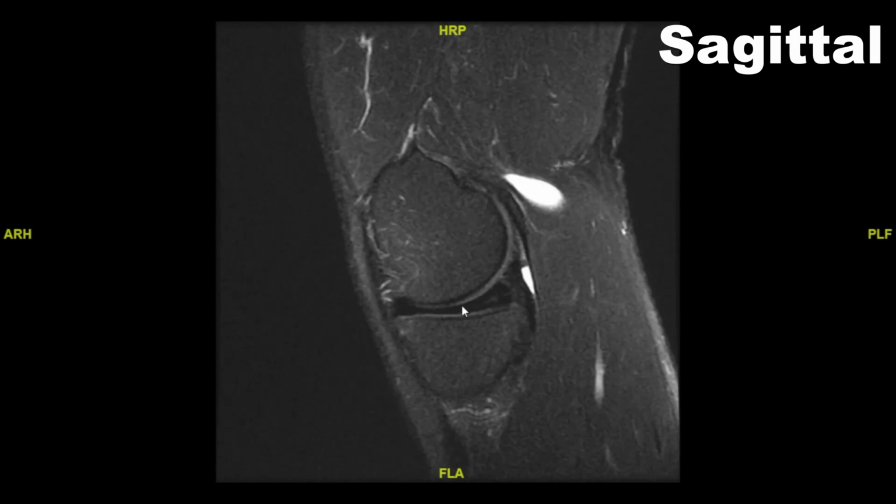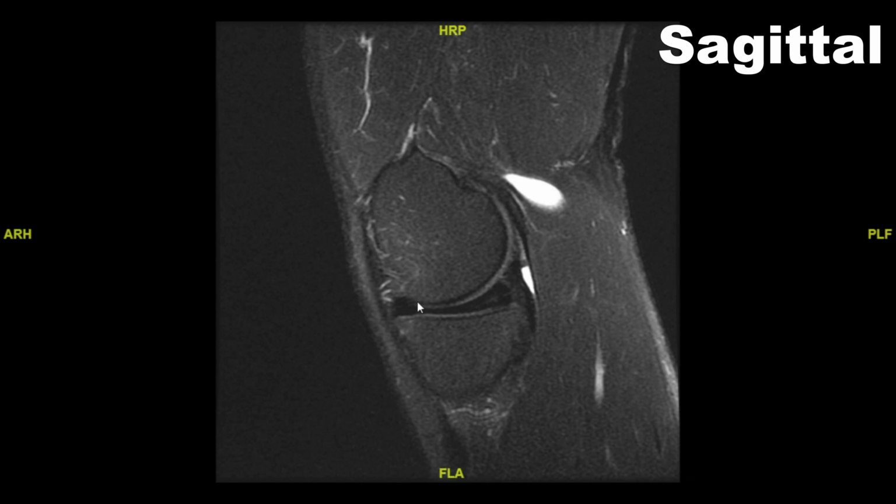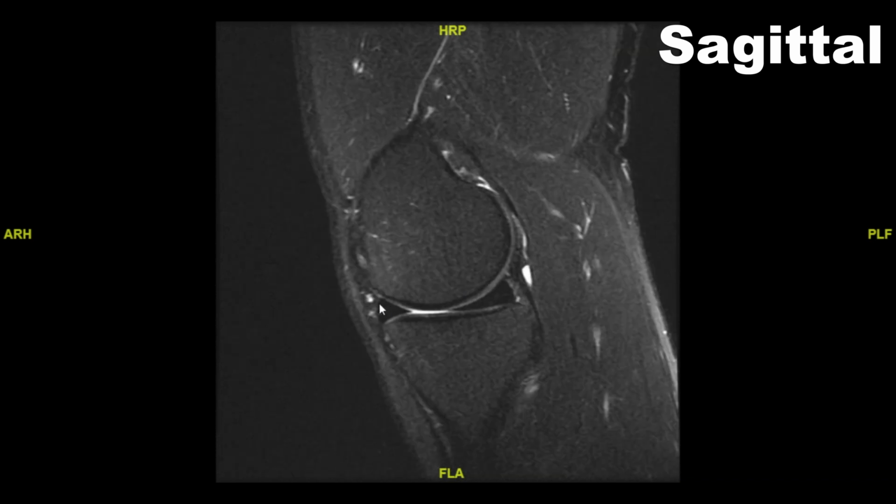And so we'll move to this. This is the medial side of the knee now. And femur and tibia, and then this black structure right between it is the meniscus again. And so we'll start moving through it. In the front of the meniscus here, you see as we move through, the shape of the meniscus starts to change as we take cross sections through different parts of the meniscus.